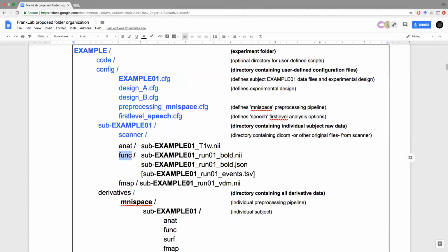But when you say that it extracts them, it's expecting them to. So is that like during the import? Right. When you run the FL basic import, that basically creates all of this stuff. If the anatomical file that you specify in the config file is actually an anatomical file from FreeSurfer, it will also create these additional directories with that information. That is where the import of the FreeSurfer information happens.